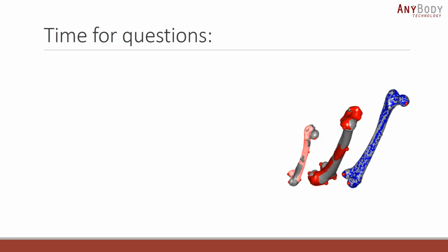In this particular case, it doesn't work very well because the closest point algorithm that is implemented inside flips the points back and forth. Because of that, we stop at using just the landmarks, and that gives us a reasonably good match. You may need to use a few more landmarks, and I think that might solve the problem. But this can be done as well, I believe.